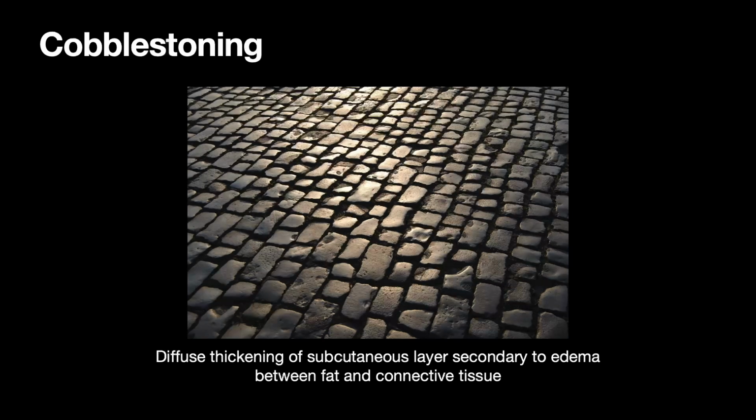The ultrasound finding is meant to mimic that of cobblestones on an old road. Again, this is diffuse thickening of subcutaneous layer secondary to edema between fat and connective tissue.